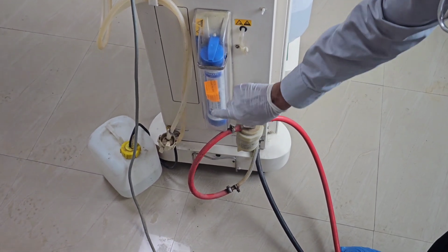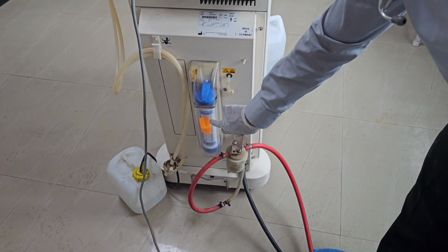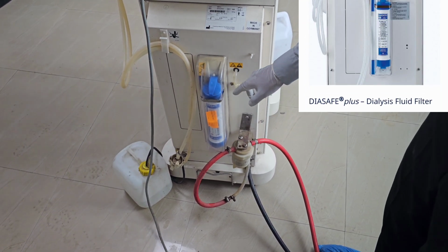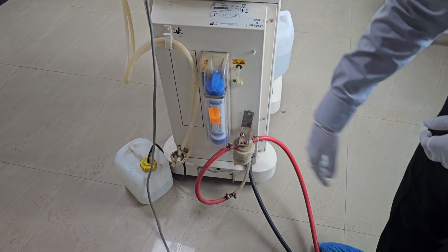The RO water, this will provide a final cleaning of the water. It is called diasafe or water purifier. It has to be replaced every 99th day. Approximately, you can remember 100 days it will work, 3 months. After that, it has to be replaced.